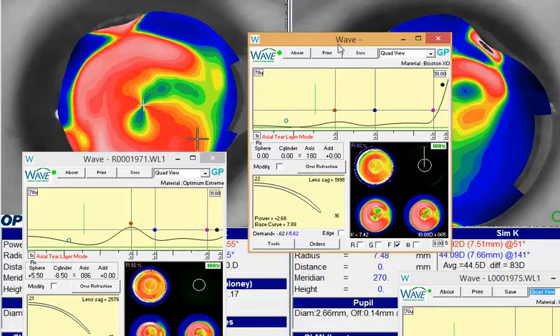Okay, so I took that same right lens in the axial design, and what I did is I moved the red to be a little closer to the inner part of that red zone. I didn't want to go too far down. I usually stop somewhere around 4, just because that's where I like to stop.